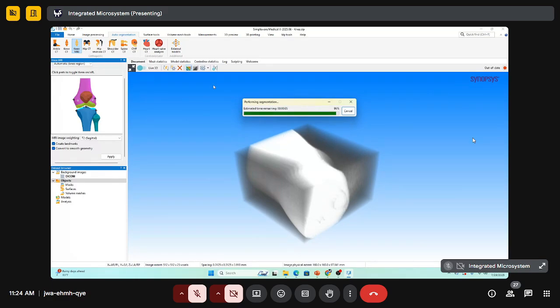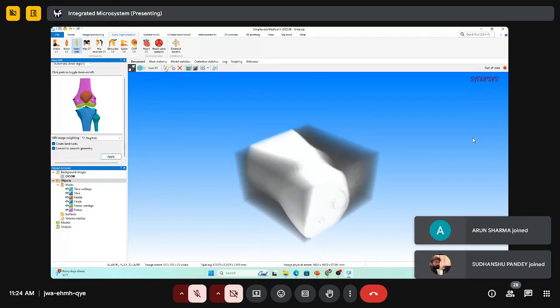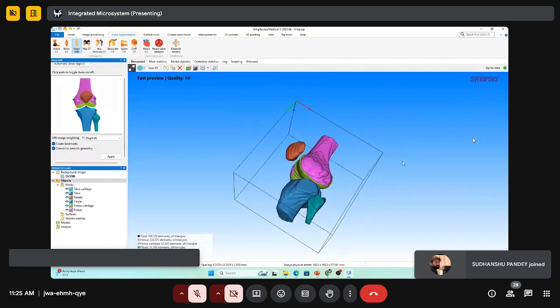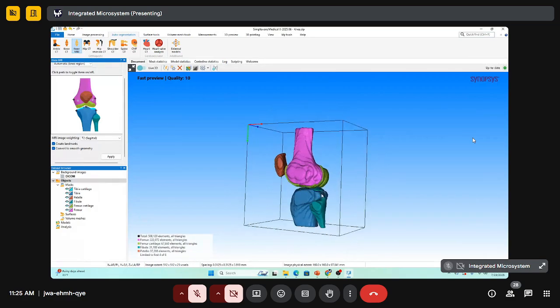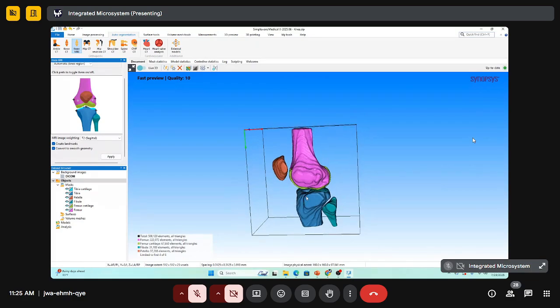It also depends on the GPU of any system that the software is working on. So it identified all the issues. So we will click on generate fast preview, and see how it generates the MRI version of me. Previously, we were seeing the CT scan version of me, and now it is an MRI version of me segmentation.